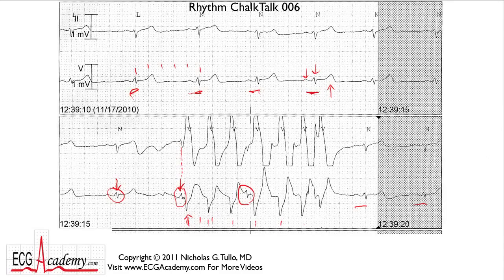Well, let's get our calipers back out again. And if we map out these signals, given that there's a little bit of sinus arrhythmia and you'd expect a little bit of irregularity, there seems to be something that's right here. And if you bring our calipers back out, this beat occurs on time, plus or minus a couple of small boxes, but remember there's a little sinus arrhythmia going on. So what do we have here?